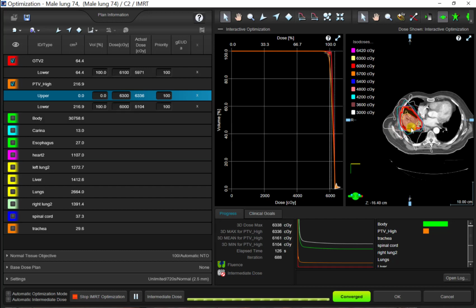And a lot of times I would say over half the time I will do that. I will hop in here quick, turn this on, see what my dose looks like on those more difficult plans. A lot of times I'm like, oh, I don't like how it's streaking over here or this or that, and I will adjust and try different angles until I've really finalized what beam angles I want to use. But if you're happy with how this looks, second thing I do is start adding all my OARs in, okay?